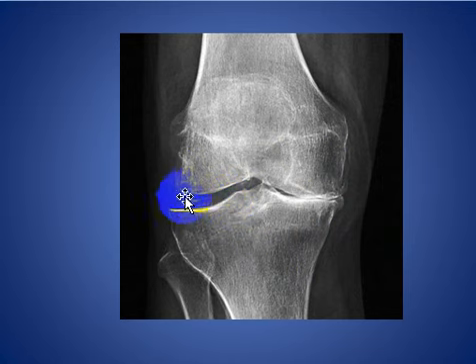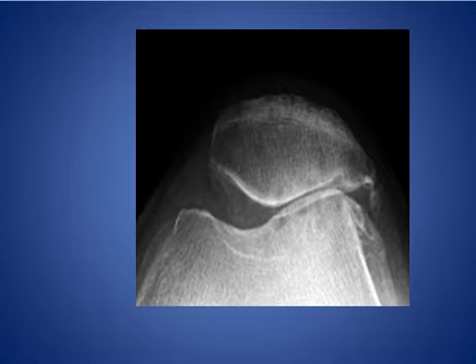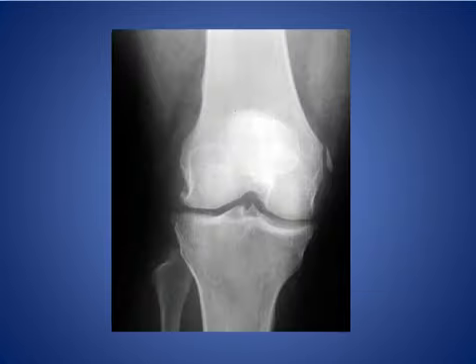And we see here also the chondrocalcinosis with calcification of the meniscus. Here, this is the same patient with patellofemoral osteoarthritic changes with subluxation of the patella.